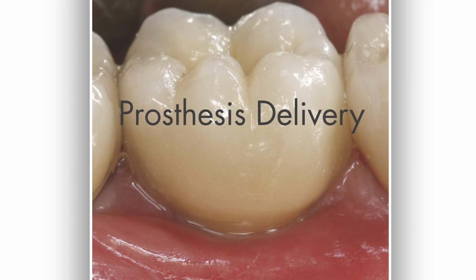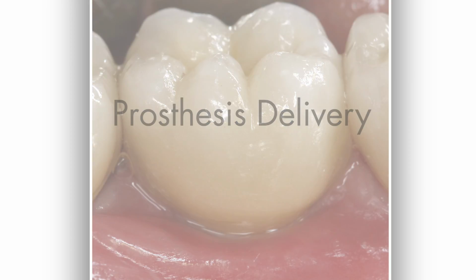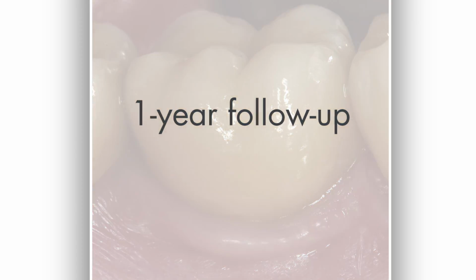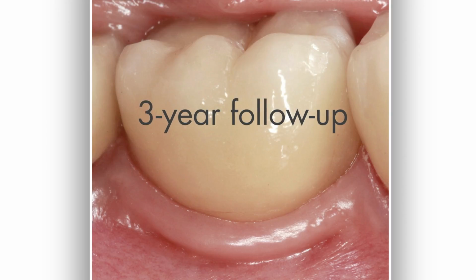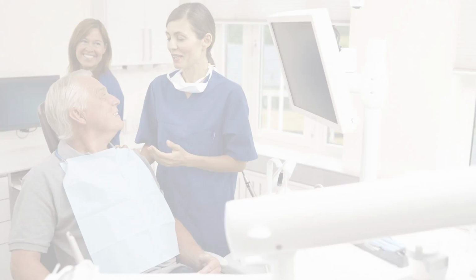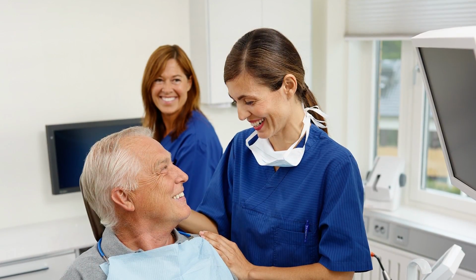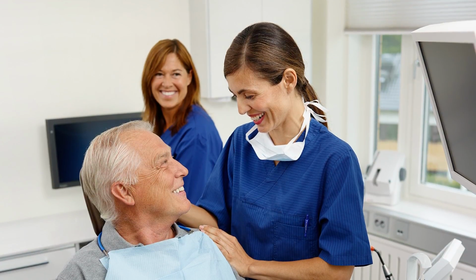As a result of the 360-degree bone preservation, soft tissue aesthetics are maintained, or, as seen in these case images, even improved. Ultimately, when OsseoSpeed Profile EV is used, the patients benefit because they get a natural-looking final restoration.